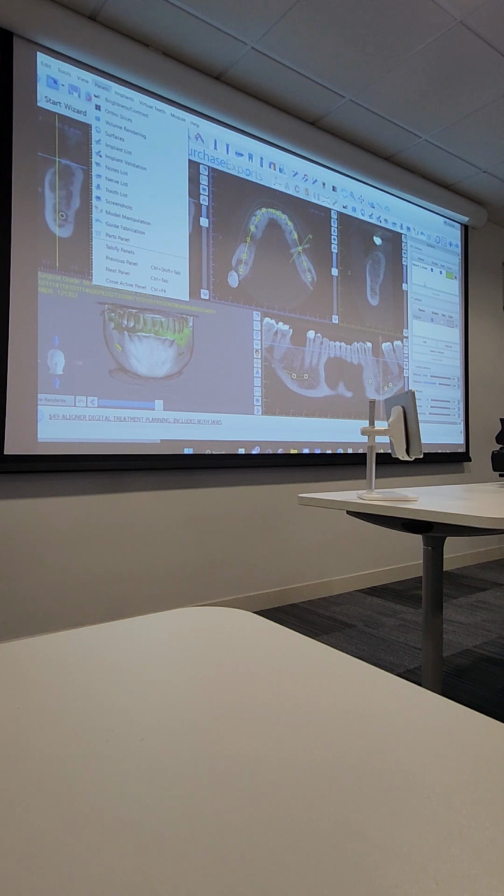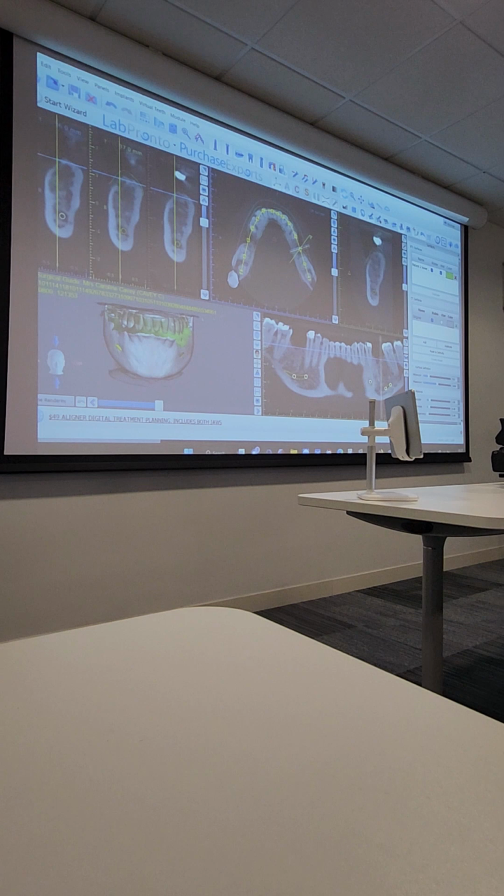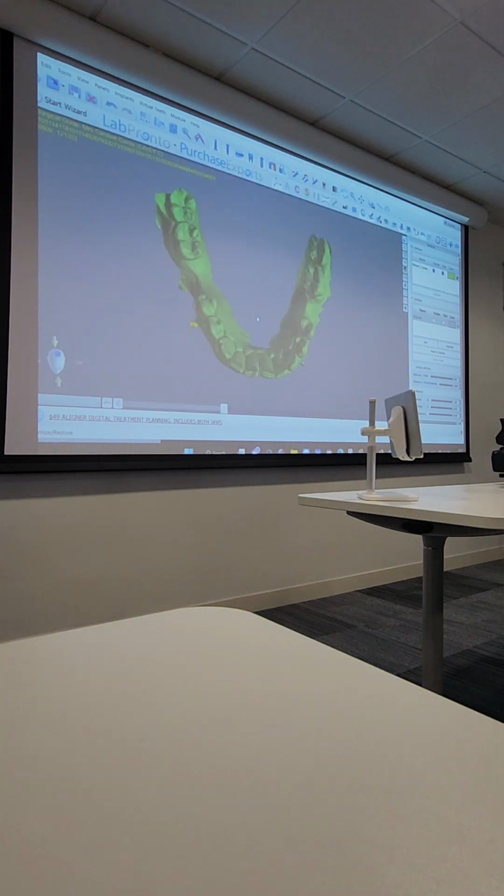Now everything is color coded, so you can see that your STL is in green, and that's what you see here. We're always going to keep that. However, this is no use. It's just distraction. Now that I've got my alignment, I get rid of this, and these are the buttons to make it visible or to make it go away. Easy. So I'll get rid of that. I'll go to the top right corner and maximize this window.